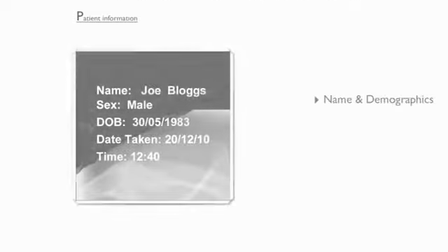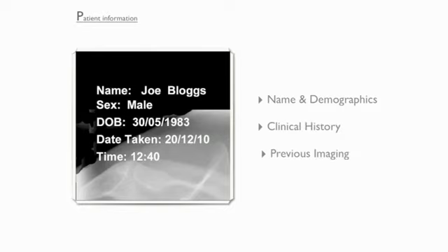You should always begin by identifying the patient's name and demographic details. Review the clinical history and previous imaging, as these may provide valuable evidence in support of your initial diagnosis. The next 4 items in our mnemonic review the technical quality of the radiograph, starting with inspiration.